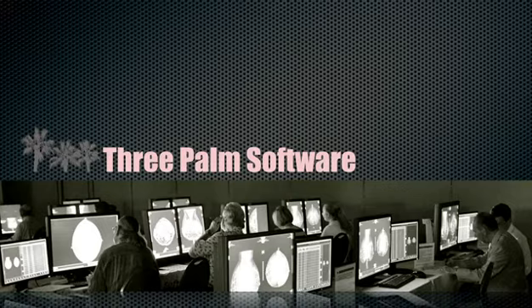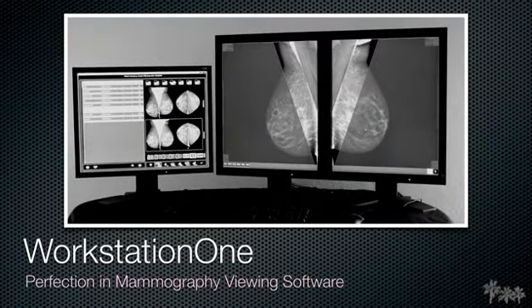and information. This is WorkstationOne, the vendor-neutral diagnostic breast imaging workstation. We've worked closely with a strong medical advisory team of radiologists, resulting in a workstation software tailored to their precise needs. WorkstationOne maximizes both efficiency and accuracy when reviewing images for screening and diagnosis.